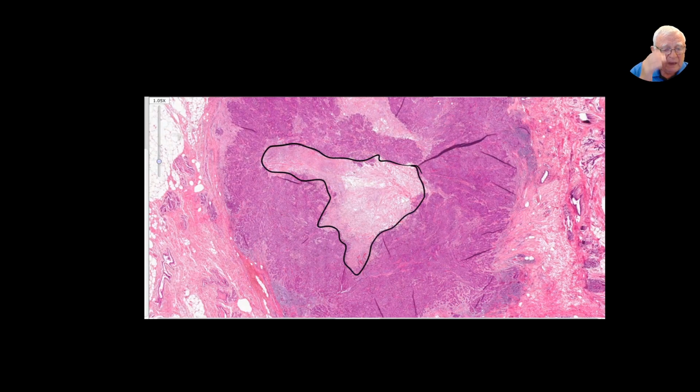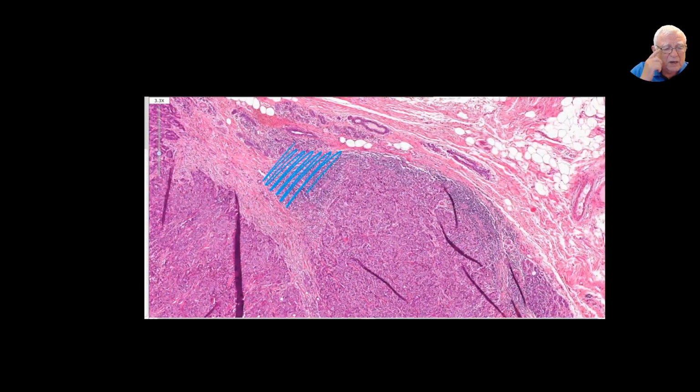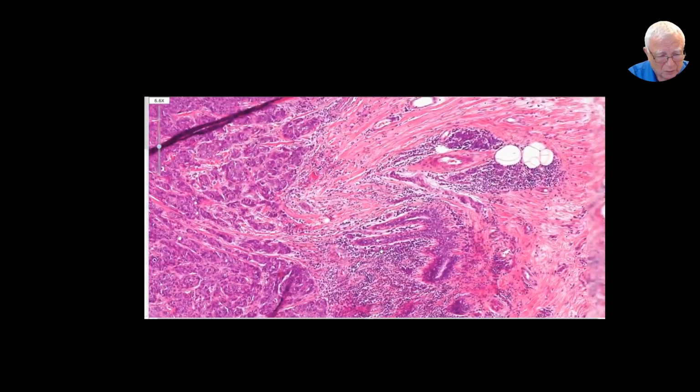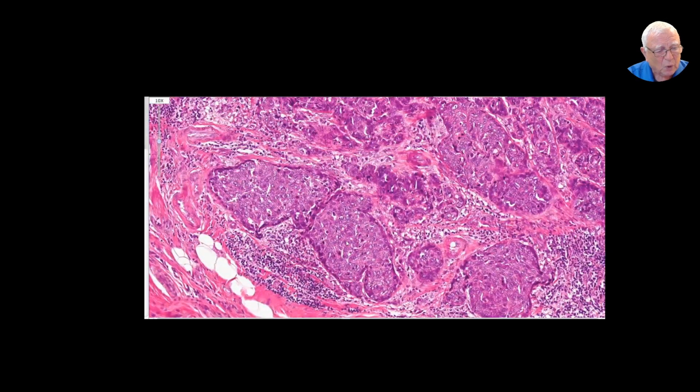However, you should think about that this, what I'm showing you, measures only 4 microns. In 16 millimeters, there are 16,000 microns. Yes, there are some duct-like structures here and there, and I'm going to show you more. Here it is. The mother of all these bad boys.